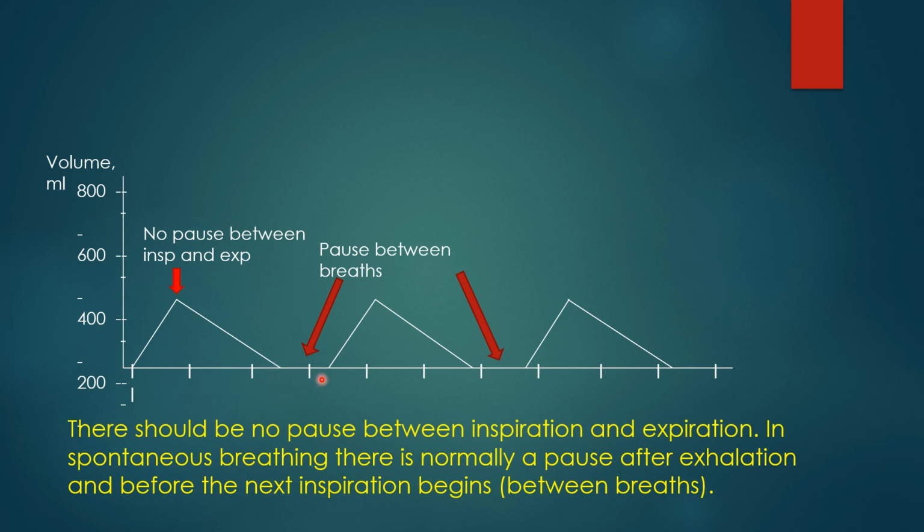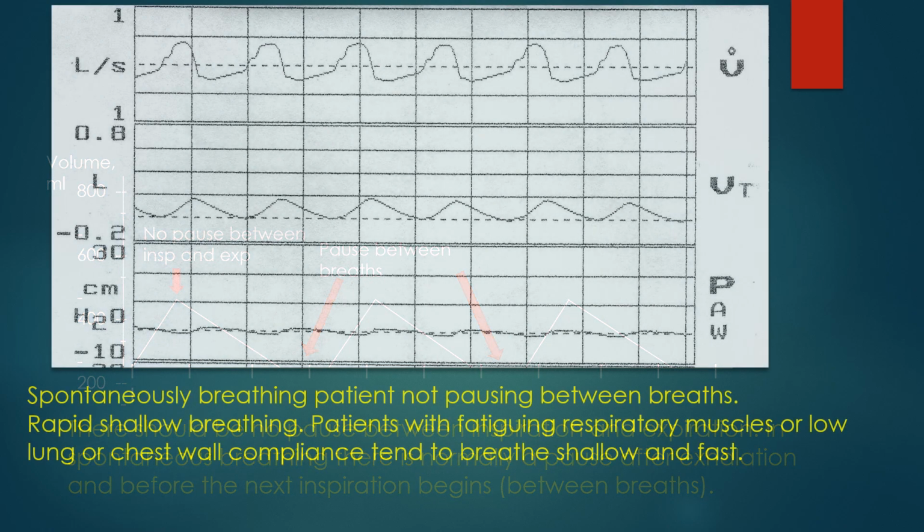Now, there is a pause at the end of exhalation, the patient's exhalation, and this pause here is also normal. It is normal in patients who are not sick and on a ventilator feeling air hungry or short of breath. Often you will see the patient, the air goes in, the air comes out, and right away the air comes back in. That's not a good sign, but it's a real common thing to see on a ventilator. Normally though, when we're breathing quiet, spontaneous breathing, we exhale and then there's a little pause before we take the next inspiration.